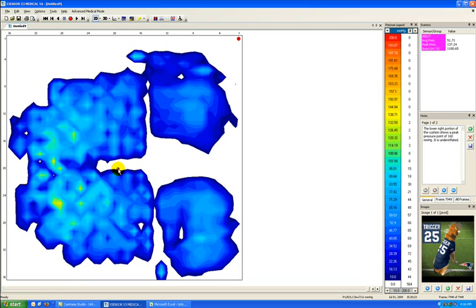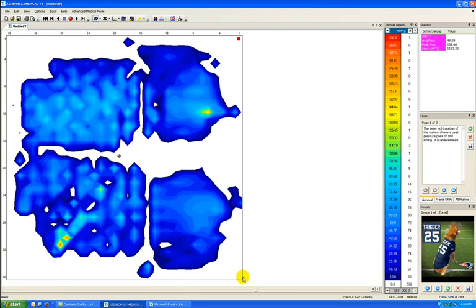So I'm able to see that I was tilting slightly towards the right, and that marks the center of pressure. This also works from side to side too, so I can see whether the pressure was centered perhaps towards my knees or towards my back. And so I'd be able to see whether from side to side or from front to back where the center of pressure fell during my session.